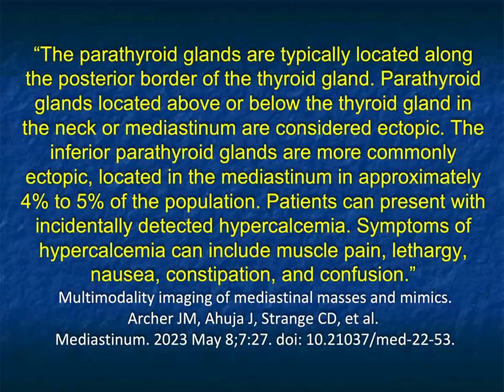Now, most of the time when you see an ectopic parathyroid adenoma, it's a few millimeters in size, and usually you tend to say, oh, that's probably a small node. Now, if the patient had symptoms of hyperparathyroidism, then you would think about it. Also, one thing about parathyroid adenomas, they're very vascular. That can help you as well. Patients with hypercalcemia have symptoms of muscle pain, lethargy, nausea, constipation, and confusion.